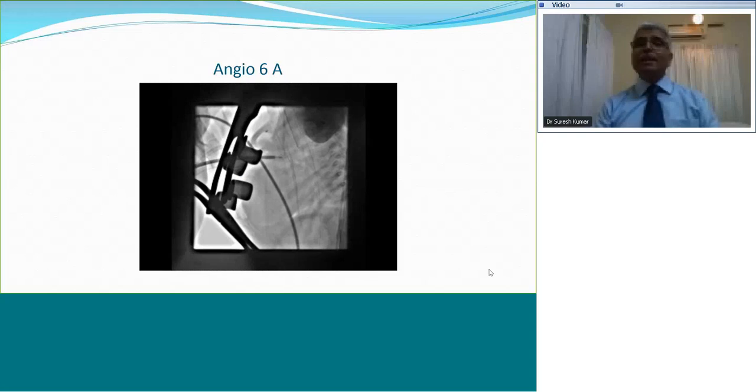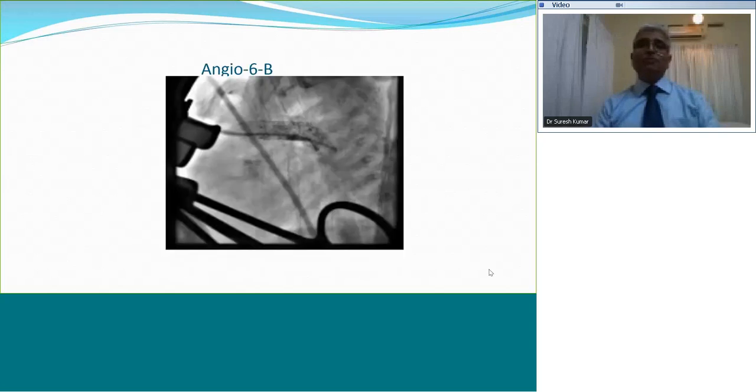If not, I'll go to the, this is an Angio 6A. Oh, Riyanka, you got it. And I was about to tell you, see the next angiogram, and then you will get the answer. Riyanka is spot on. So what is it that we saw?